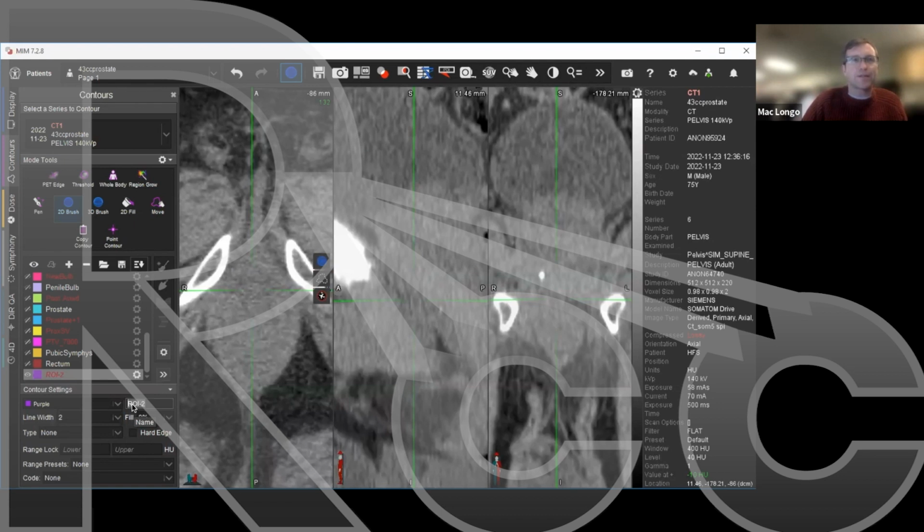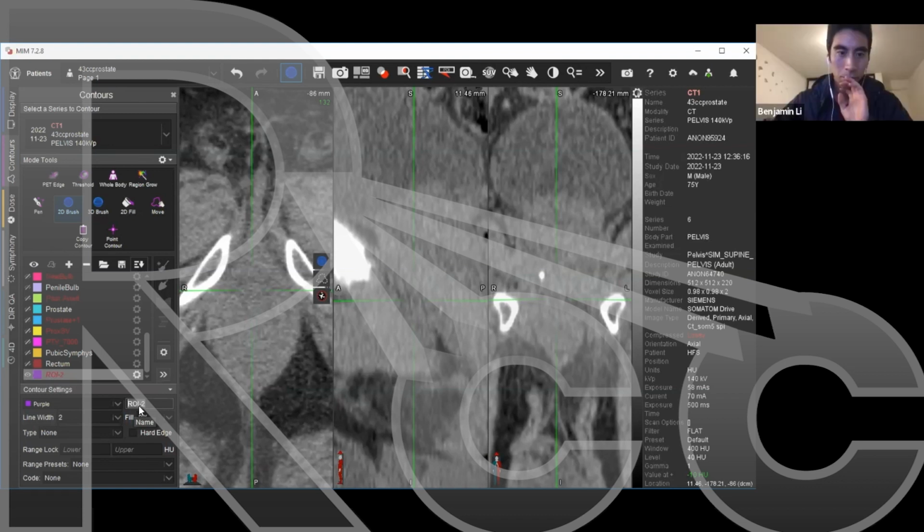You really want to contour what you think is penile bulb rather than totally focus on the shape appearing perfect. We know the atlases that we all refer to are choosing the best anatomy, but in reality, human pelvic anatomy is highly variable. So axial, it typically is round or a little bit oblong, but in the coronal plane, that's where it's more of a teardrop shape.